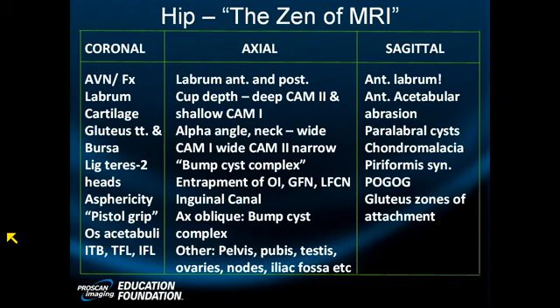Let's look at our 2 millimeter axial. Let's see where we are. I'm challenged. I don't think I can see a labral tear in the anterosuperior quadrant. Here's the marker on the right. You can scroll it with me. Down low, I've got an area of triangular deep signal. So at this point, I'm still voting for a sulcus, even though I think I should have a tear. I'm not there yet.